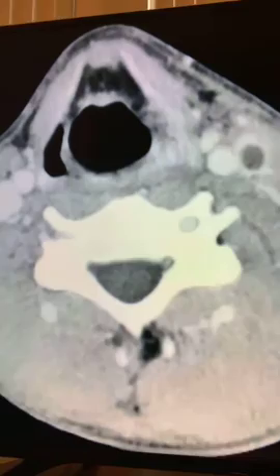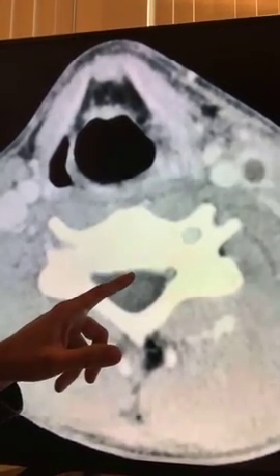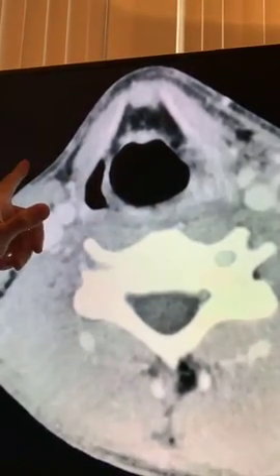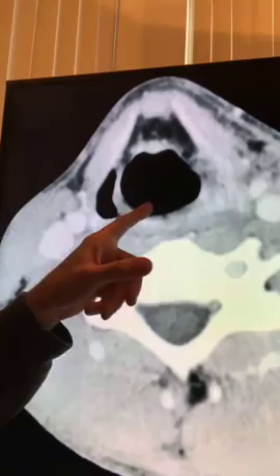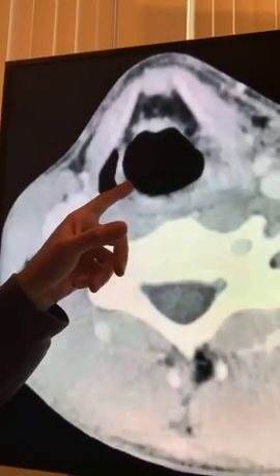So we already knocked off a bunch. We ruled a bunch of things in and a bunch of things out. We know that this is a contrast-enhanced CT of the cervical neck. All right, so we got all that done. Then you got your internal controls. I've talked about this before, right? Remember, this internal control, this density right here is fluid. What does this look like? Well, I don't know. Let's look around right here, right? That's air. So you have air. So you know that this is kind of the level of the mouth, the throat. So we're around that area right here.